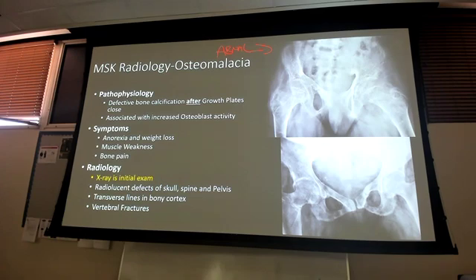So for the normal, those radio opaque lines, are you going to see a ton of them if it's osteomalacia? Which one are we talking about? This one, right there. That's going downward, it's more vertical, right? That's going to be more of a nutrient vessel, but yes, this is not a case where I have one line and I have osteomalacia. It happens across the pelvis.